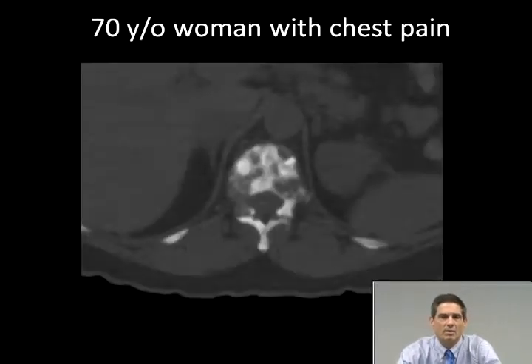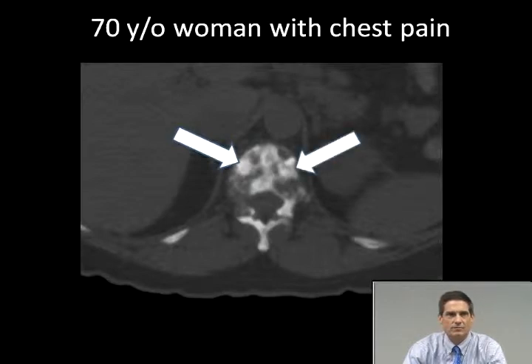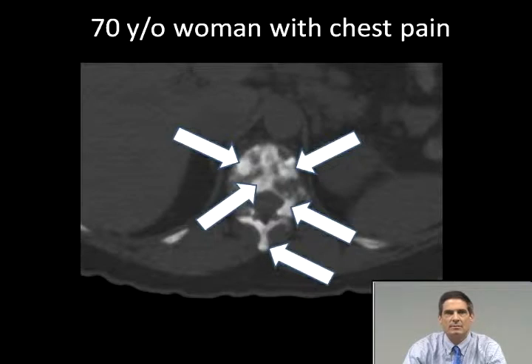Here on image 71, we see a great deal of abnormal texture in her vertebra. There are areas of basically sclerosis here with this arrow, another arrow, two arrows showing additional sclerosis, more sclerosis back here. I mean, everywhere you point to in this vertebra, there's abnormal texture. And there's some areas of lucency. It's hard to tell whether that's normal bone or whether that's abnormally moth-eaten bone from tumor.